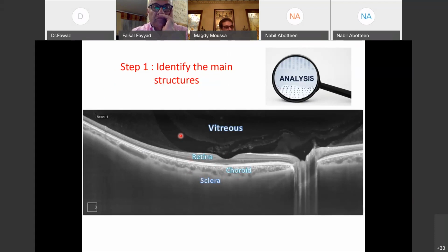Sometimes we may look at these empty spaces and ask ourselves, do these spaces actually represent a vitreous detachment? Actually, these spaces are normal anatomical spaces, discovered since the emergence of the era of the swept source. We call them the bursa premacularis and the area of Martegiani.